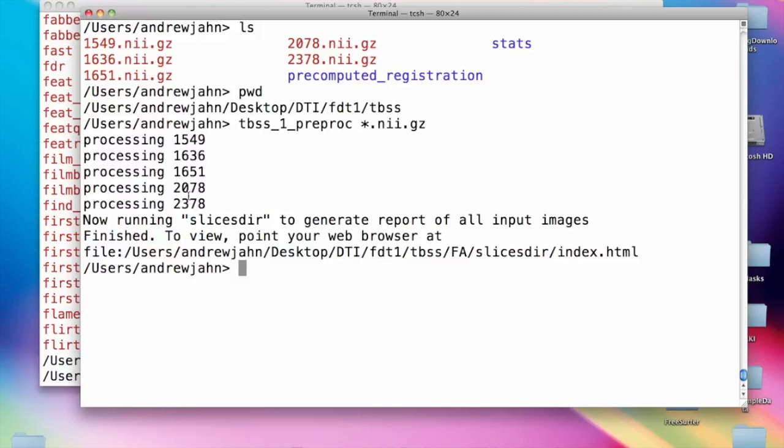And this is an important step in any step of neuroimaging analysis. After you do something, just pretty much every time, I'm just going to lay this down as a rule. I don't always follow it, but it's a good thing to just keep in mind and to feel guilty about when you don't do it, is to look at your data after each step. Okay, so that's what we are going to do.